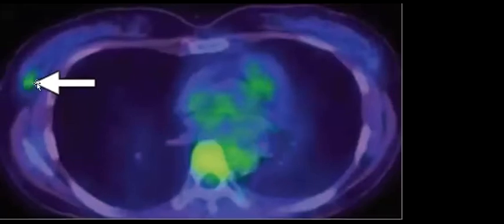Yes, there is abnormal uptake in the right breast, which indicates that there could be a lesion. And maybe there is a lesion in the vertebra, but to be honest, this can happen as an artifact, where the uptake in the heart could shift to the adjacent vertebra or adjacent organs. So sometimes you should check clearly what it could be. Is it vertebral metastasis or just artifact from the heart in general?